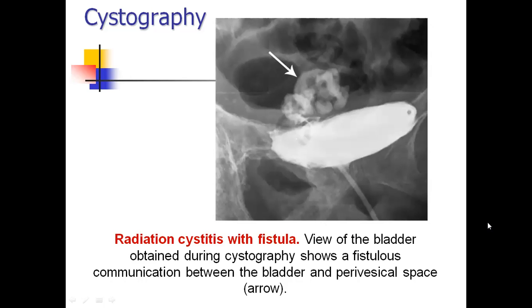Example of cystography and its value in diagnostics of urinary bladder lesions. For example, radiation cystitis with formation of fistula.